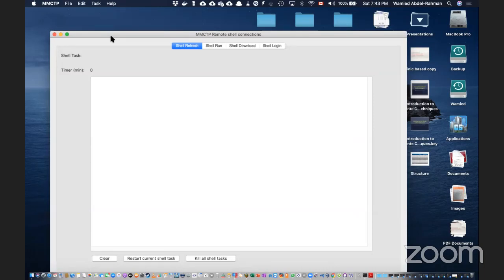So for example, I have my Raspberry Pis, that is a shell. So I will need to define where is that cluster or computer that I want to send calculations to. You can have multiple. So if you, for example, could not succeed with Slurm to create one single cluster, that is still fine. If you have 3 computers, each computer you can configure as a separate node for calculation. So then one field will be calculated in one computer, the second field will be calculated in the next one, and so on. So that is fine.